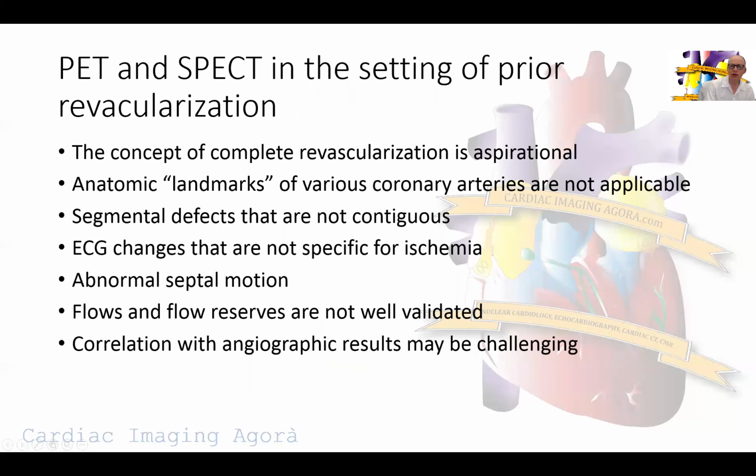So just to sum up what we just talked about, we often talk about the concept of complete revascularization. I think it's more aspirational, despite the fact that this patient at baseline had complete revascularization. All 3 coronary territories were revascularized. You can see there's no way of going around the proximal disease in the vessel, especially in the LAD. Now, later on, years later, the vein grafts to the RCA went down and caused some problems too.